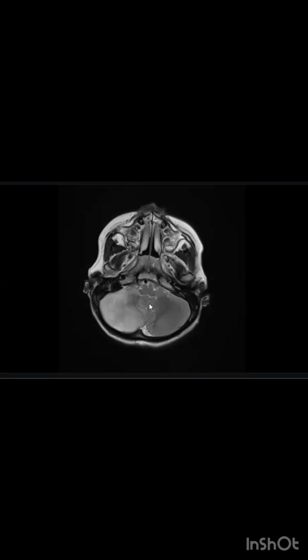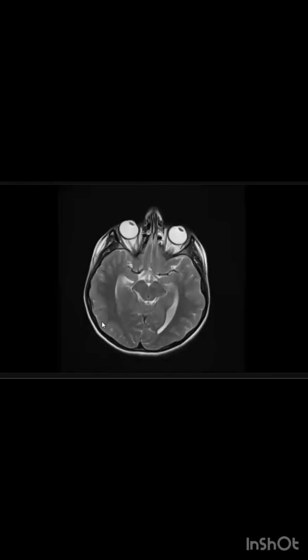In this situation it can cause it, but if the patient does not have any acute history, it is a less likely differential as it is involving the whole territory. So I'm more concerned about... Okay, now I'm provided with the DWI sequence. On the ADC, it is not showing low signal intensity. I would like to see the corresponding DWI image to confirm diffusion restriction. On the DWI, I cannot appreciate any significant diffusion restriction.